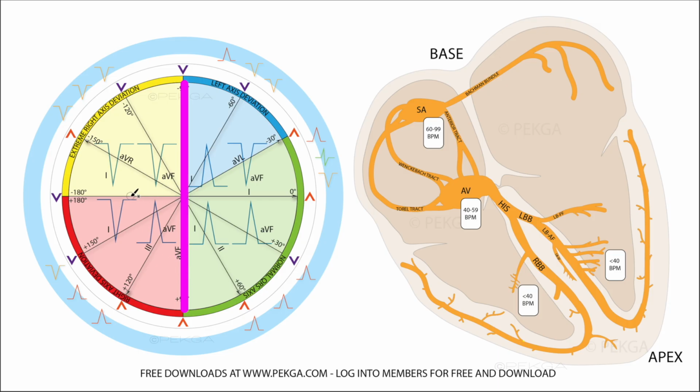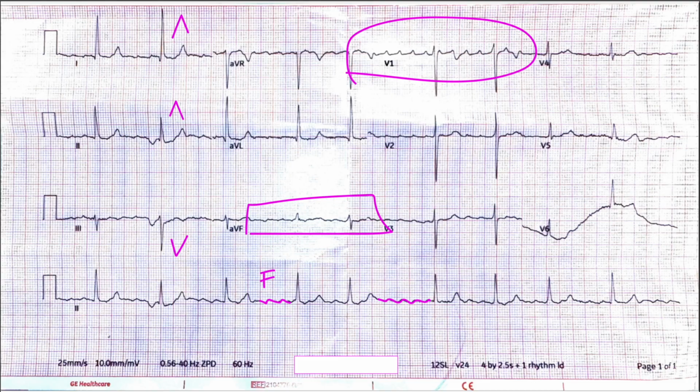So whatever's going on, it's happening exactly at 90 degrees to it. The lead at 90 degrees to it is lead 1, right? Lead 1, if you recall, was upright. So chances are this just confirms that our initial speculation was that the axis of depolarization is right around 0, maybe a little bit more positive. Here you would say it's right at 0. So just another method of deduction.